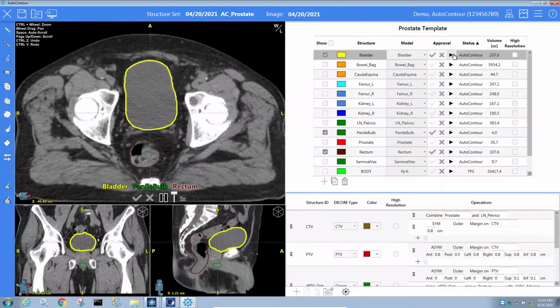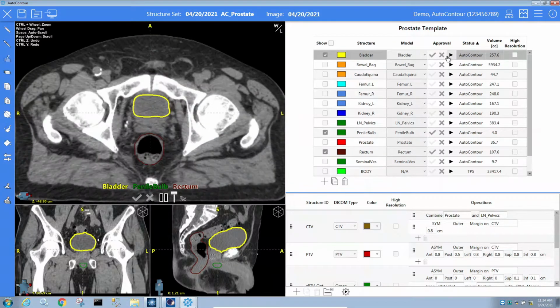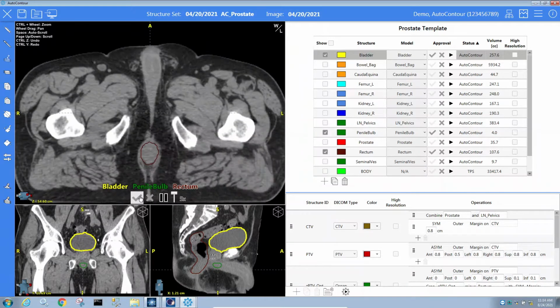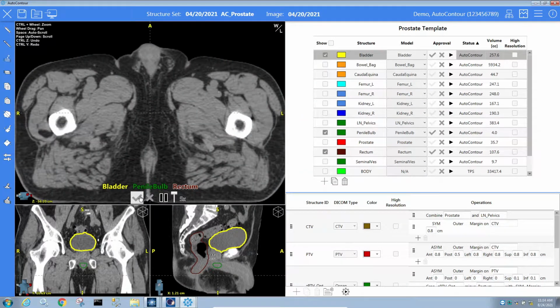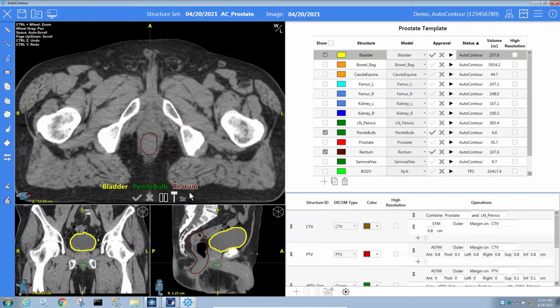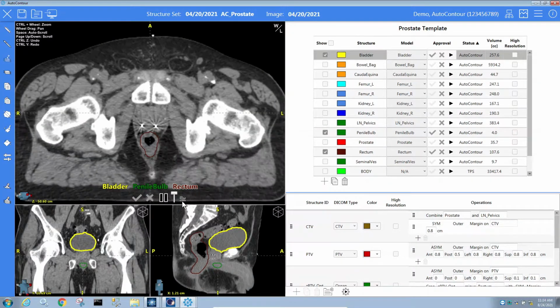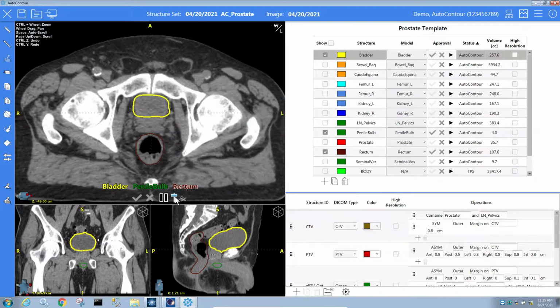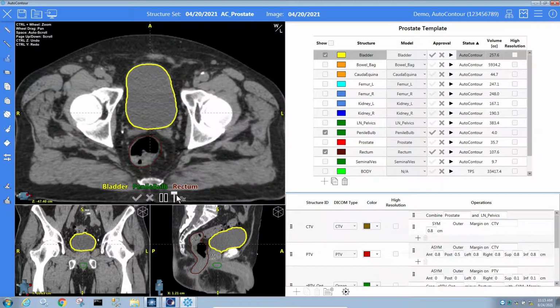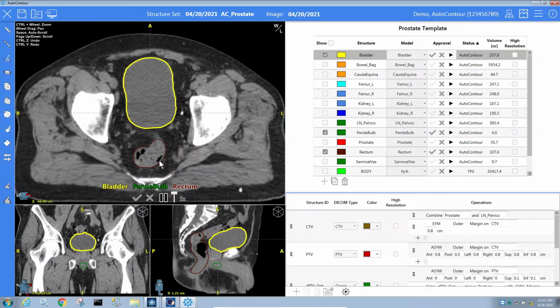Now our command center for the review process is down here in the center of our axial window. We have our approval, our rejection, as well as our play pause. And then the last section here is the scroll speed. So right now we're at 5x. We can certainly slow that down just by clicking and dragging this. I can pause the scroll at any point by hitting the pause button or simply clicking in those axial slices.